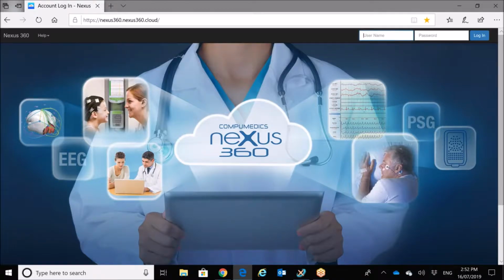Hi there and welcome to today's tutorial on creating filters for lab physicians in NexUs 360.